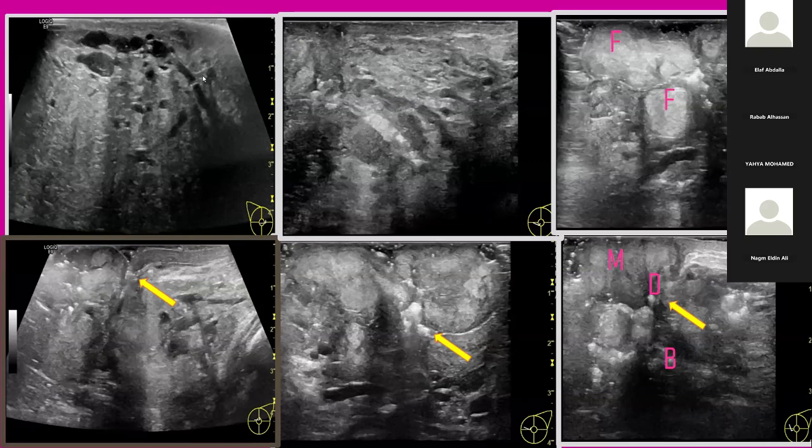One ductal convergence normally pointing toward the nipple with dilated fluid-filled ducts, because she is lactating and she had active lactational breast changes with increased vascularity, ductal dilatations and glandular background ground glass parenchyma.